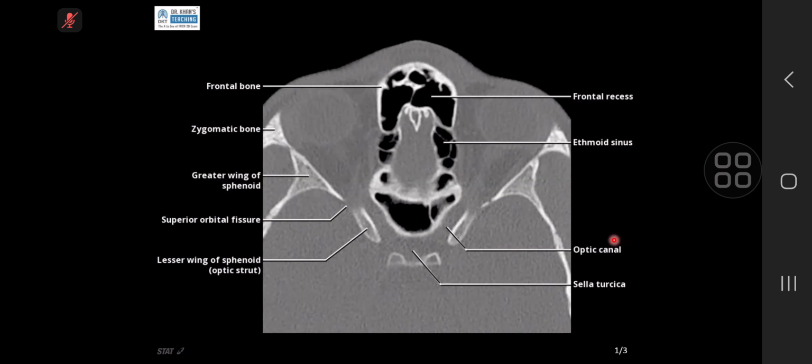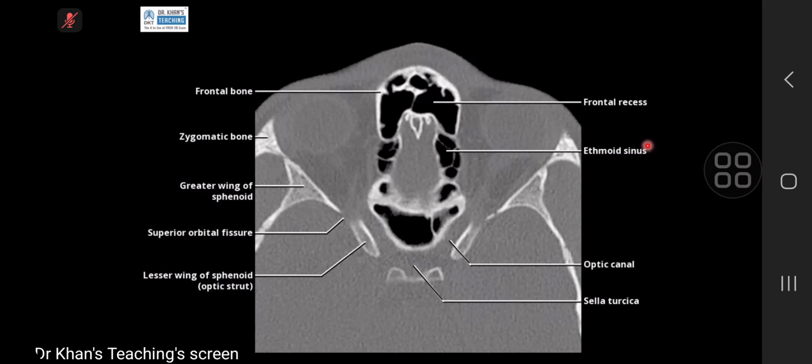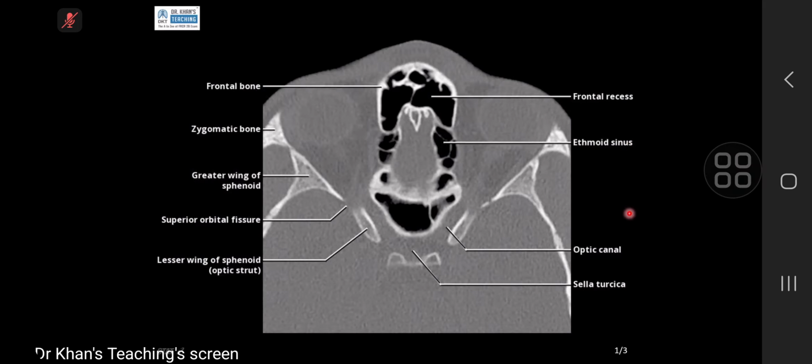It's a very good idea when you learn anatomy to learn it part by part, small part. So here we are just going to concentrate on the foramina which are going into the orbit. Don't concentrate on anything else. Now, if you see here, this is the medial most portion. So orientation wise, this is the posterior clinoid. This is the optic foramen, right? This is the optic canal, and the foramen will be sitting here.